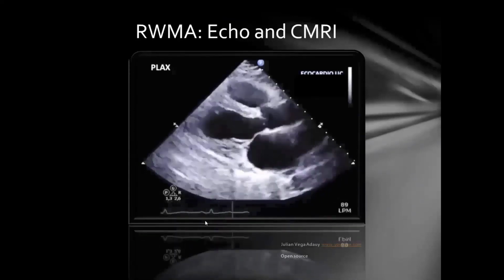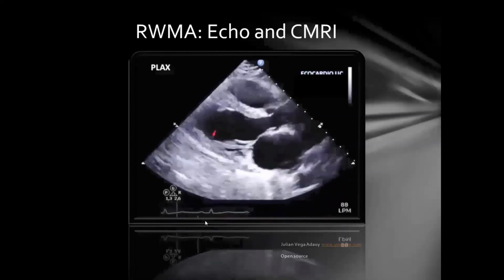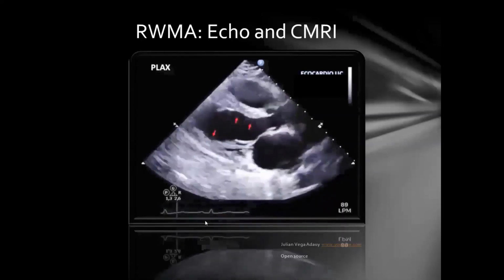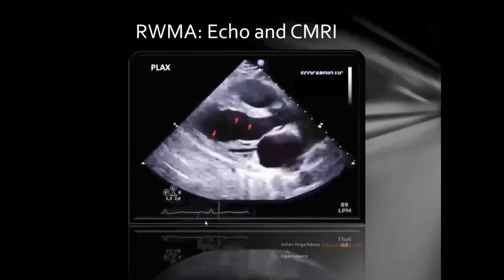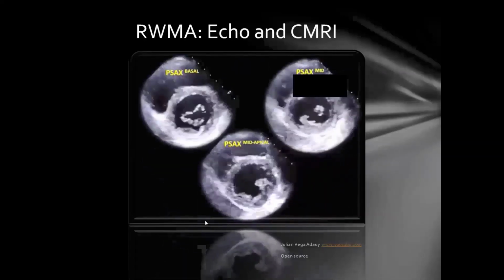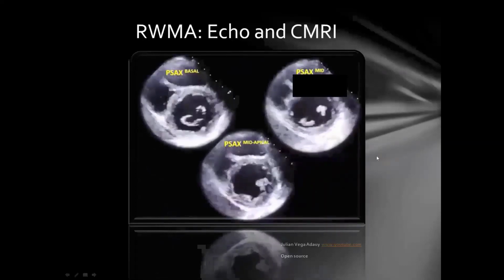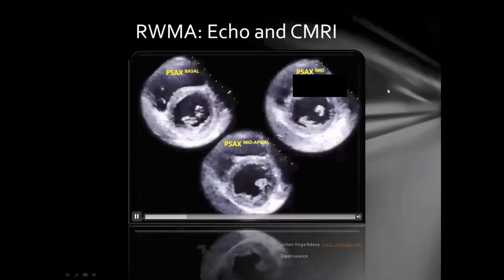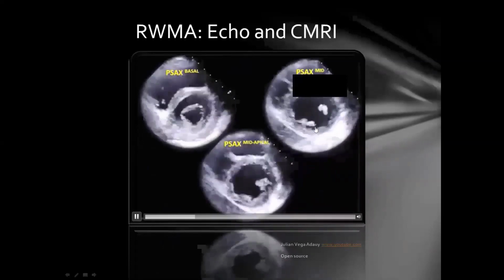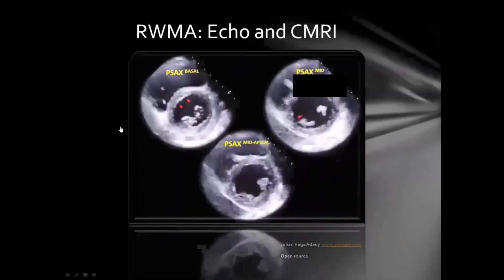Here's just another example of regional wall motion abnormality. This is the same patient. This is an interesting regional wall motion abnormality. You can see where Dr. Ade put the arrows on these really regionally specific areas around the papillary muscle, like here, where it's just not quite coming in. And, as you can see, it's varying. Like this is contracting well, not so well. It's just variant.